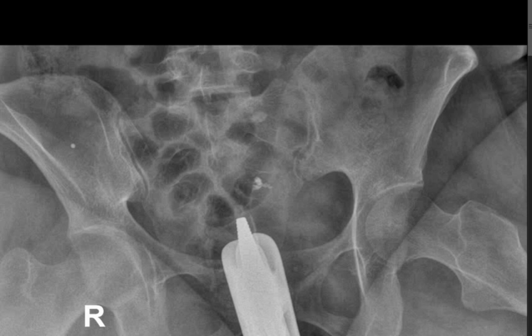So good morning, everyone. Today we continue with our case presentation session. We will start with this case of a 37-year-old female patient who presented with secondary infertility. Her exams were normal, so hysterosalpingography was ordered for her.